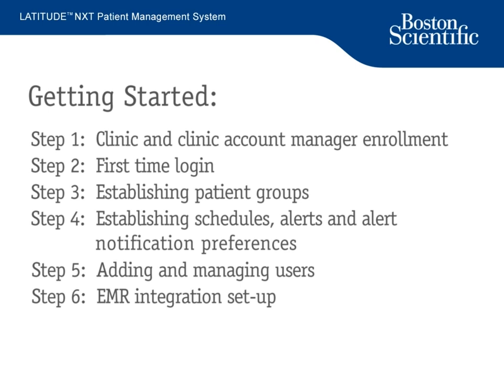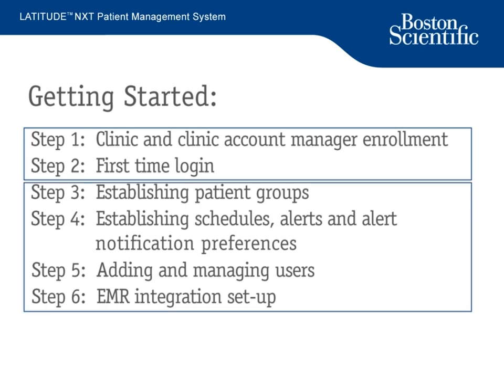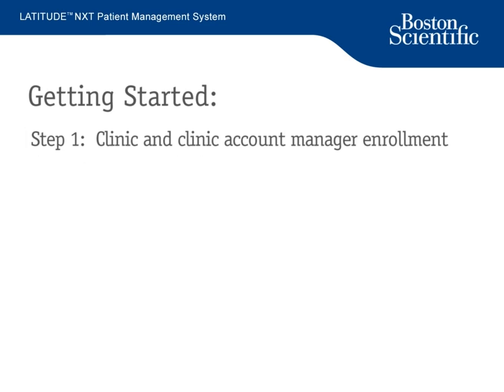This specific training module will walk you through steps 1 and 2. Steps 3 through 6 are available as separate modules on our YouTube page. Let's start with enrolling a clinic and clinic account manager.